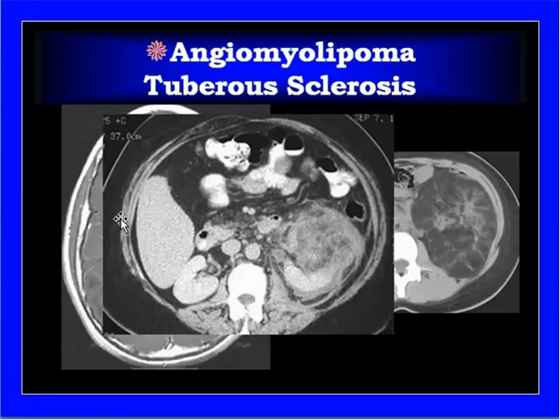Angiomyolipoma. Sometimes they are very tiny, benign lesions, but sometimes they are quite big and they may interfere with the renal function because of the compression. In this case, on the left side, you can see the excretion of the contrast through the left kidney, where the renal parenchyma is squashed against the large tumor.